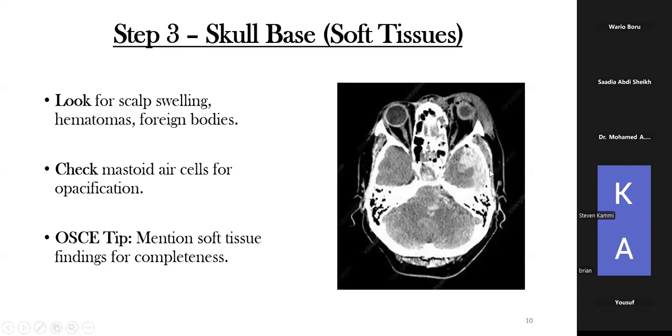Then look at here in the subtemporal space. Compare this. I hope, Sadia, you can see my PowerPoint. My pointer. Yes, Doc, we can see. Yeah, so it's a matter of comparison between the two sides. So look at this side and then look at this side.